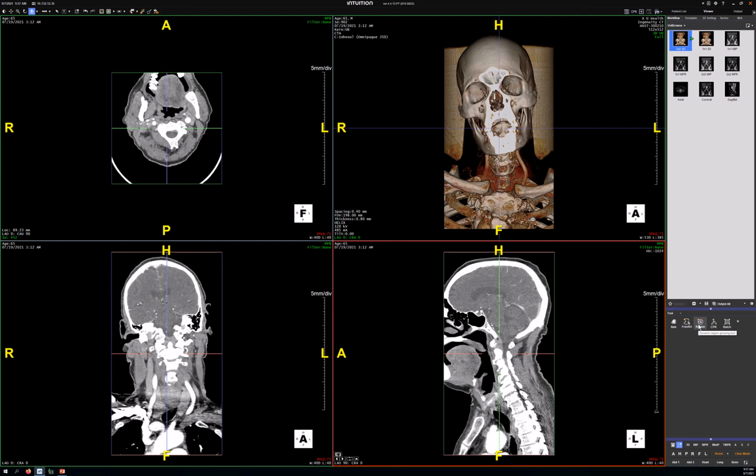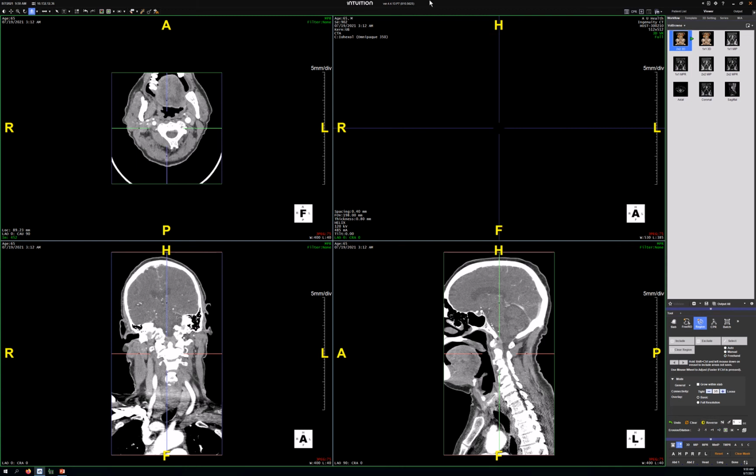So I see you're thinking about things we've done in the past, Nia. That's correct. Why don't you click on region of interest? This is a semi-automated technique. We're going to do freehand or manual? Well, we're going to do freehand. Okay. In fact, I don't know what manual is. I've only used auto and freehand. We're going to have to figure that out. Okay. And if you go down to the bottom of the tool panel, there's a yellow, yes, reverse.